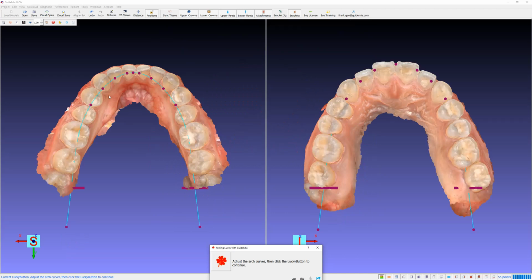You would need to make sure the scans have no major problem. The models should be trimmed to the right size, margin areas should not have heavy artifacts, and crown areas should be relatively clean without huge bumps or plaster chips, bubbles, etc. Normal scan quality issues will be automatically taken care of. If you need to, you can use some functions under the tool menu to trim the scans.